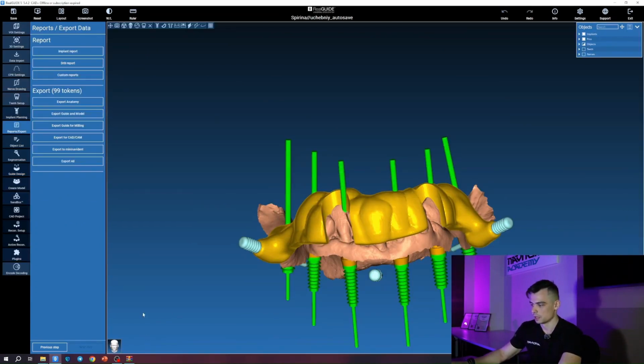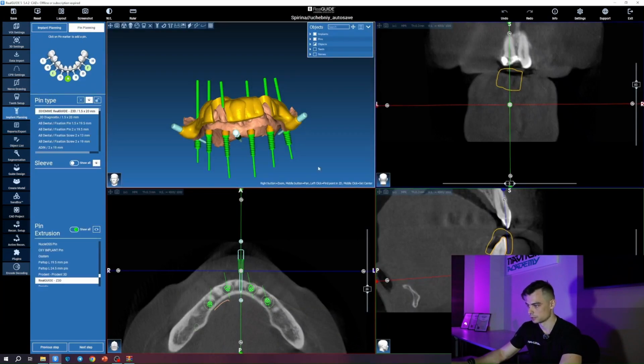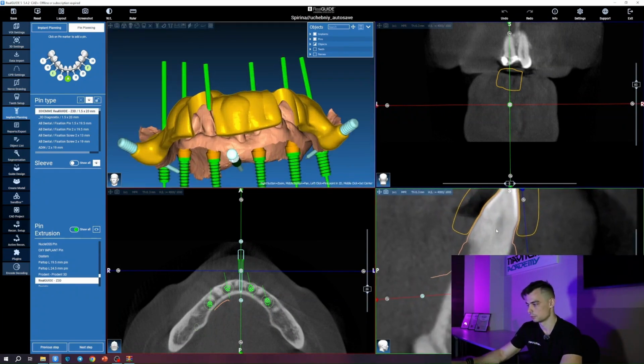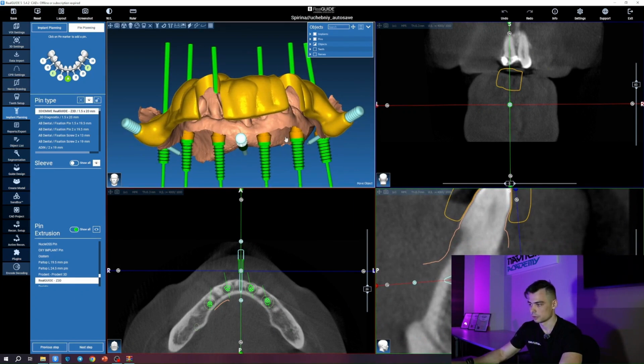And now, once again, why didn't we include this pin? Maybe someone didn't understand. I'll repeat, this is important. And what do we do about it? We didn't include it because we don't have information about where the vestibular fold ends. That's just how the scan is. There's nothing we can do about it. But will it be a mistake that we have 3 sleeves for fixation pins at the next stage when we make the template, while here there are only 2?